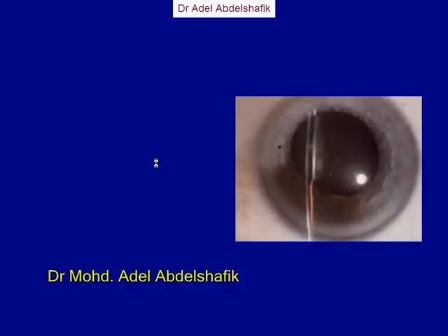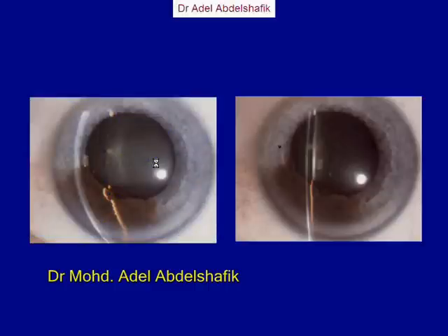I'm going to show you some pictures. This is the first one, and this is a second one. What information do you have in this image, and what information do you get of the same patient but on the second image? What do you see? Epithelium. I cannot see the epithelium. Thinner of the cornea. This one is thin.